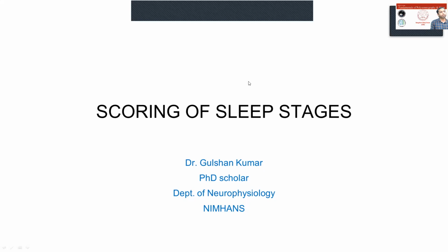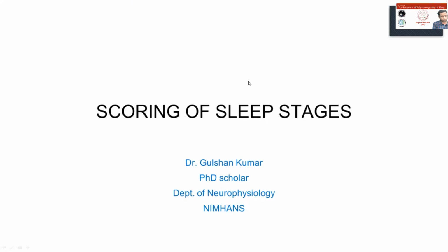We'll start now with how to score sleep stages. Dr. Arun has explained the basics of polysomnography and how we measure brain activity, airflow, and EEG activity. Those things have been explained. I will explain some parts of how to measure it, but Dr. Arun has explained it very well. And now we will start with the scoring of sleep stages.